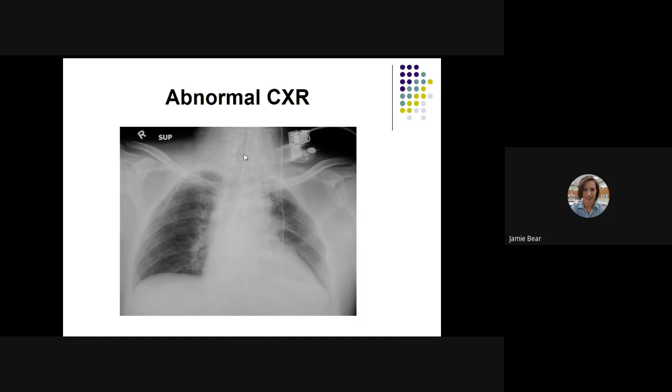Okay, so this patient is hypoinflated. They're ventilated. We see a lot of congestion right here in the hilar region, meaning there's probably some extra fluid here. I don't know exactly what's going on, I don't know their history, but this patient does have hypoinflation, most likely from some sort of restrictive component. Okay, good.